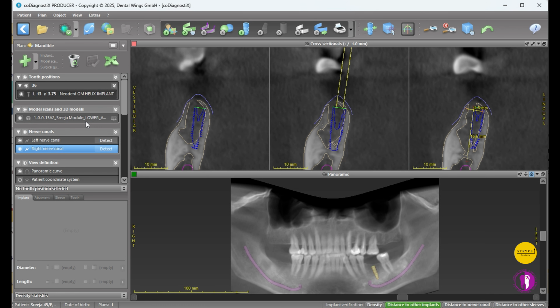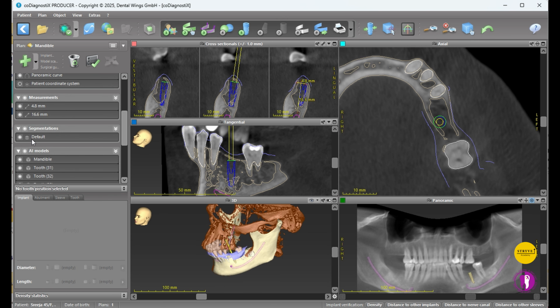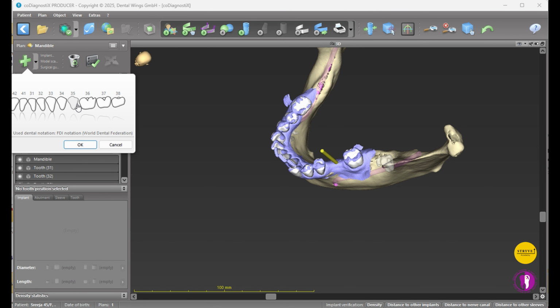See, when we are positioning the implant, we can simply position the implant, but the thing is how it is relevant to our tooth. That's the question. We always talk about prosthetically driven implants, right? So now if you see, this is the position of that particular thing. So what we need to do is position a tooth and see, right?